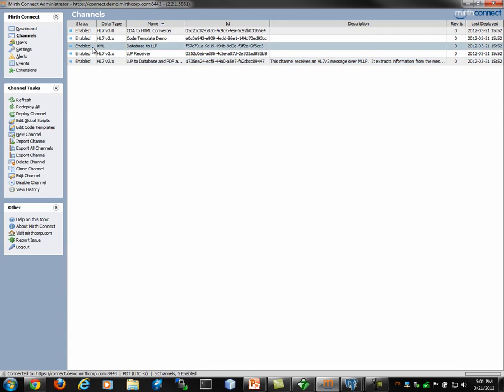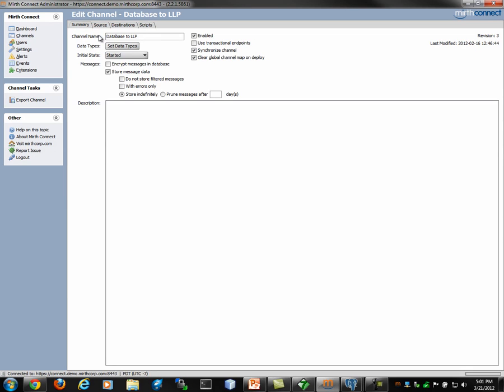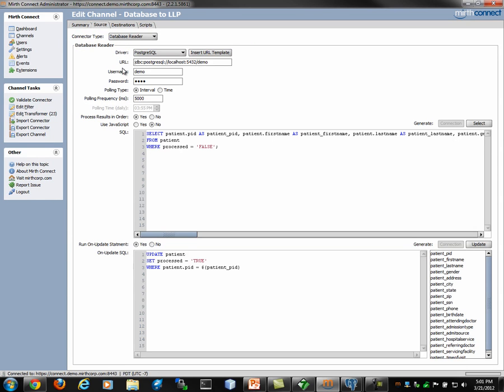Let's edit this channel. The source is a database reader. I've set the driver and I've set the URL. Made sure I'm reading from the demo database. I put my username and password, my polling frequency, and then I entered some SQL statements.